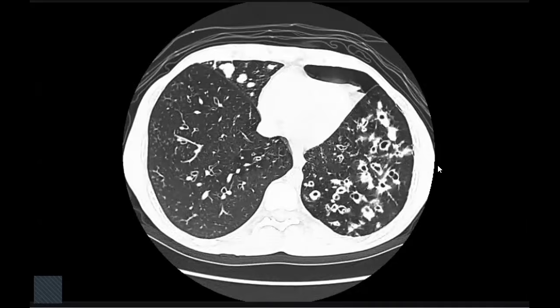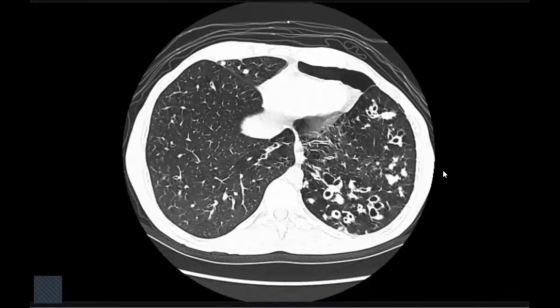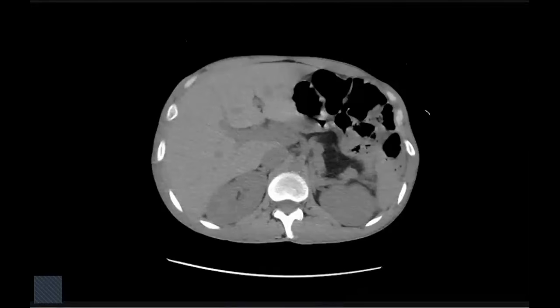This confirms the finding. I will refer this patient again to the chest MDT after putting in a chest tube and comparing with the previous, and also start antibiotics for this endobronchial infection, and look for any other associations, especially in the upper abdomen. If it's available in the mediastinal window, I want to look at the pancreas.